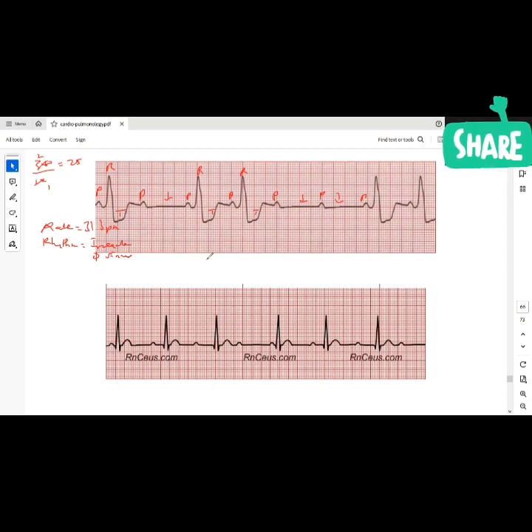If you leave the atria, how would the conduction get to the ventricle? Through the AV node. So if I'm not seeing ventricular conduction, where's the problem? The AV node. What is the AV node doing? What's wrong with it? It is not transferring the signal to the ventricle. The AV node is blocking some of the action potential from passing through it to get to the ventricle.